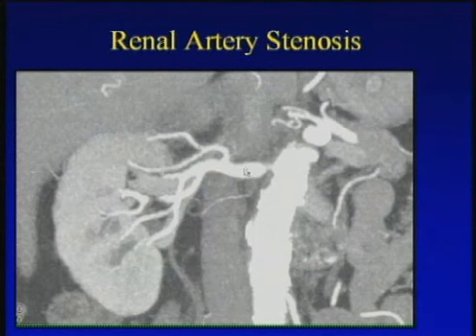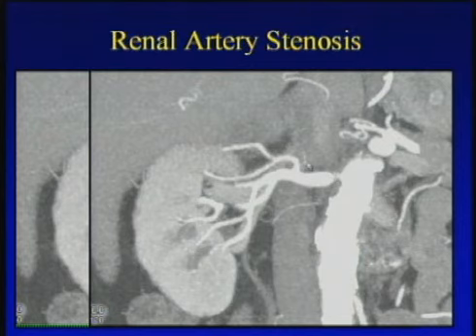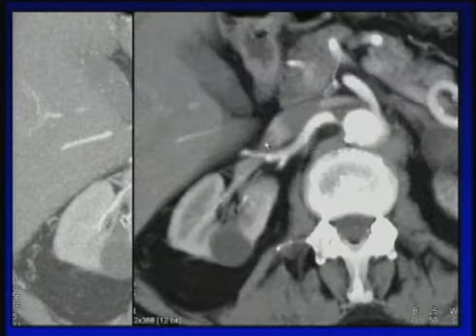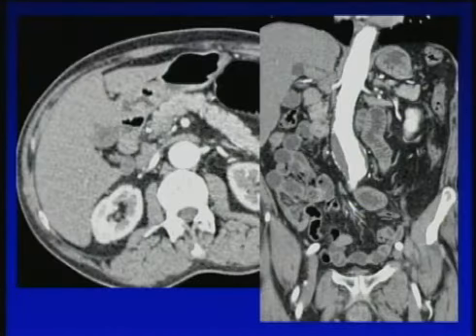It's also important when you look at stenosis, and here's another example, when you try to quantify, not to use one perspective only. Again, on a single view, you can overcall or undercall stenosis, so you need to review the images around 360 degrees, and you can see from this perspective, you really get a feel of how severe that stenosis was. So again, one of the big advantages, of course, of 3D processing with CT is this global perspective. You're not limited to a single visualization.